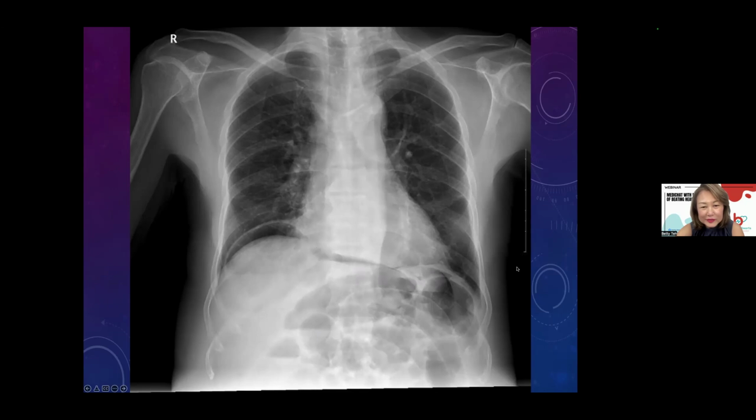On this X-ray image, the right side will be labeled on our left-hand side. So this will be the right side of the patient and the left side here. So underneath the left hemidiaphragm will be our normal gastric bubble. When there's air underneath the right hemidiaphragm, this is abnormal. And you can also see the air tracking towards the midline. So this is a pneumoperitoneum. For this, we must do a chest X-ray, PA erect, or even AP sitting can sometimes detect it as well. So I believe no one should miss these findings.